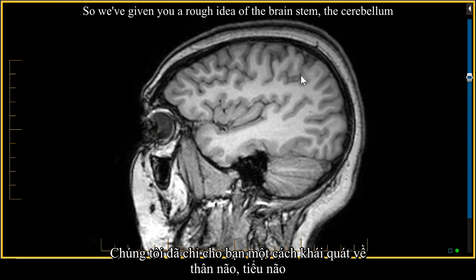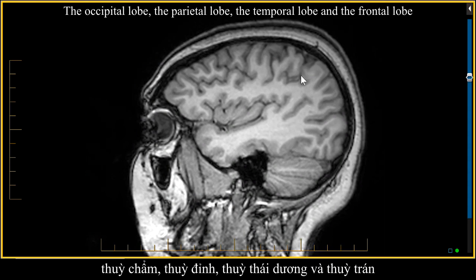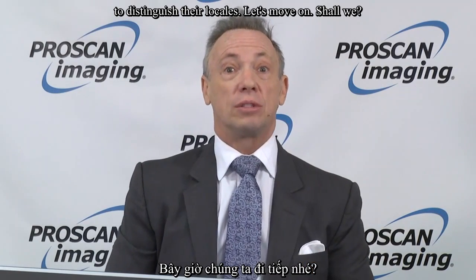vignette. So I've given you a rough idea of the brainstem, the cerebellum, the occipital lobe, the parietal lobe, the temporal lobe, and the frontal lobe, and given you the means to distinguish their locales. Let's move on, shall we?